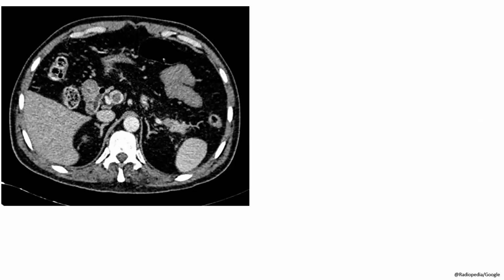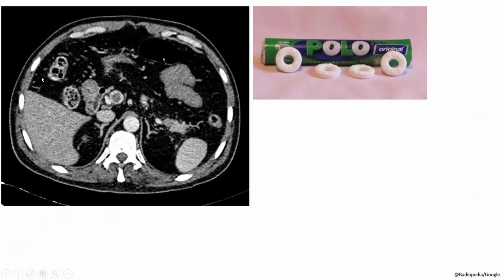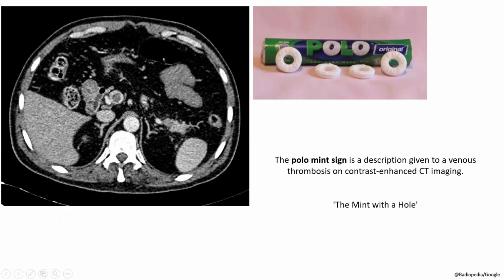What is this sign? This is polo mint sign. So this is polo mint sign, and it describes venous thrombosis on contrast enhanced CT. It can also be called mint with a hole.